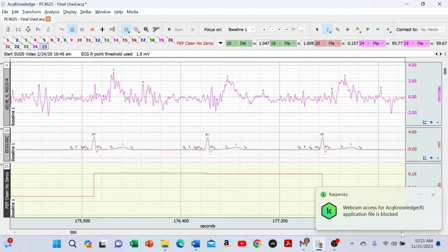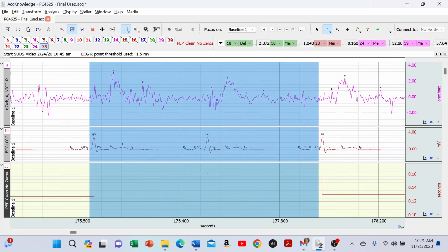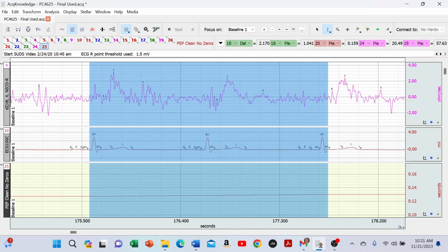But oops, here we go. Here's a couple of problems. The onset is outside of the notch, way further back from the notch, again 2 in a row, and then back to the notch. So again, we're interpolating across. Now I'm going to use my speed keys, Alt-T-M-C, and on it goes from there.